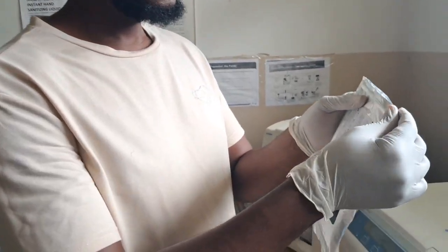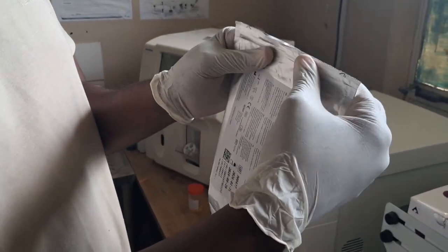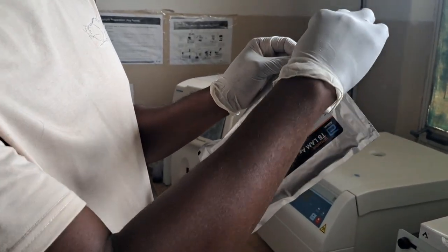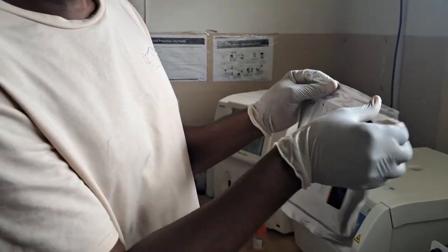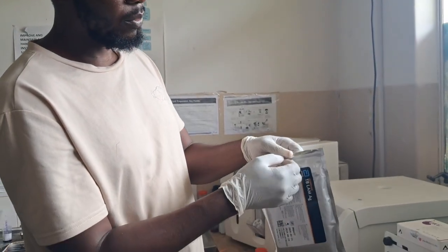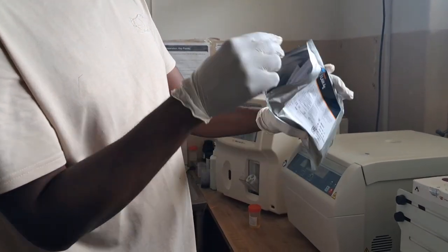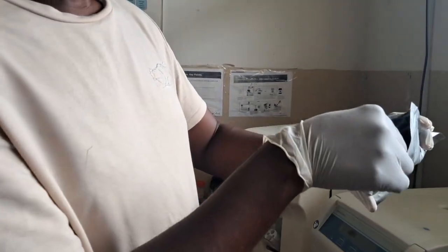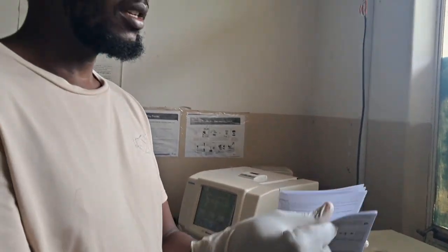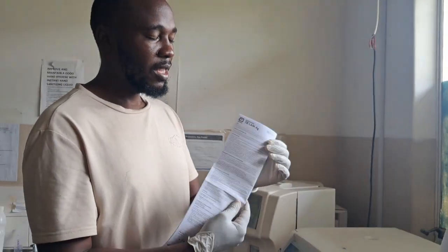So when you open it, on top it's a ziplock. It comes sealed. This one was opened before, so you rip the top part up. Make sure you preserve these locks. They are very helpful. So once you open, you'll find these things inside. This one is an insert, a leaflet. This is a standard operating procedure which comes with a kit. Very helpful in case you forget anything.